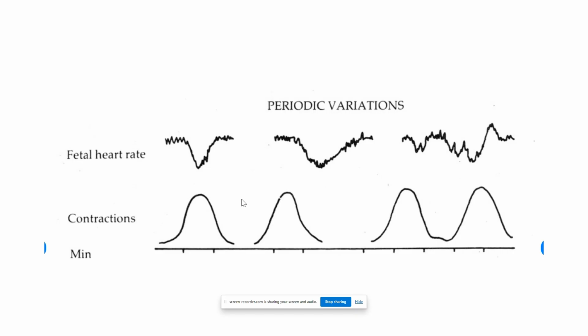Maybe she was at 4 centimeters dilated. And now that I see all these early decelerations, with that compression and a lot of those contractions, maybe she has progressed from 4 centimeters dilated to maybe now she's 6 or 7 centimeters dilated. So when we talk about an early deceleration, I'm not worried about it. I'm going into the patient's room. I'm doing a vaginal exam to see if mom has progressed further. Again, it's always good to come early to class. It's never good to be late to class. Okay. Now, moving on to the next one.